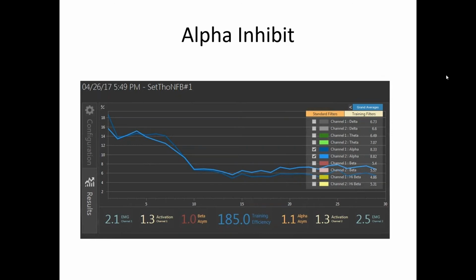So if we look at this, but I would like to come back to the trend screen, if you don't mind, Richard. So I have a suggestion. You mentioned that, you know, we see different. Yeah, that's why I said I would have done that too. There is background noise. Got it. Did you find it? Yep.